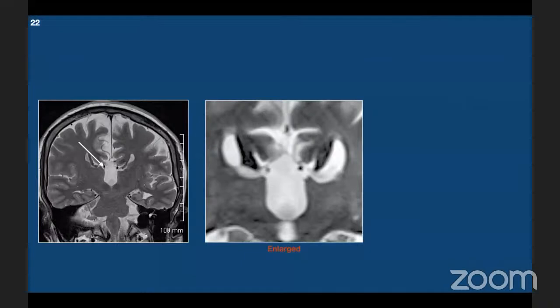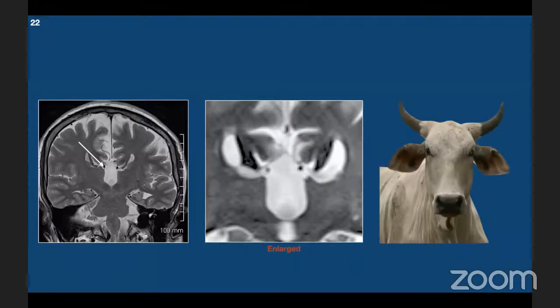This patient presented with seizure disorders. MRI reveals corpus callosum agenesis, T2 coronal slices showing slightly dilated third ventricle and increased distance between the diverging frontal horns. These findings resemble head of a toro, better seen in enlarged view, and has been described as toro sign.